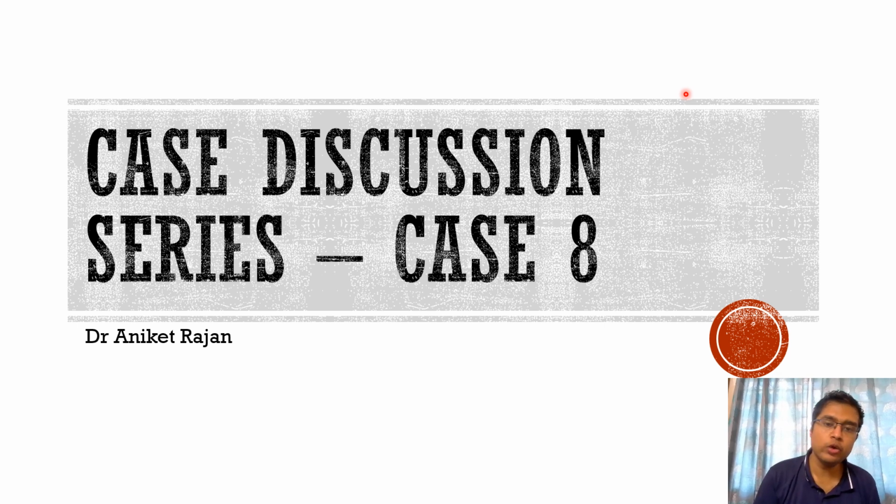We'll be discussing two cases of intraparenchymal hemorrhages, and I want you to first diagnose which stage of bleed the patient is in. It is important to stage the intraparenchymal hemorrhages on MRI, and it has been asked in the NEET SS exam in 2023 as well. So this is important, and we'll be discussing both the cases.